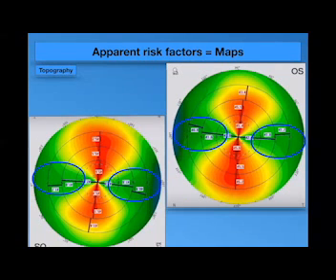If the superior point is higher than the same inferior point, up to 2.5, it could be accepted because of the superior corneal pathology which is endemic in Egypt, which is trachoma and post-trachomatous pannus, subepithelial fibrosis and vascularization, which are common in Egyptian patients. So we can accept a difference of up to 2.5.